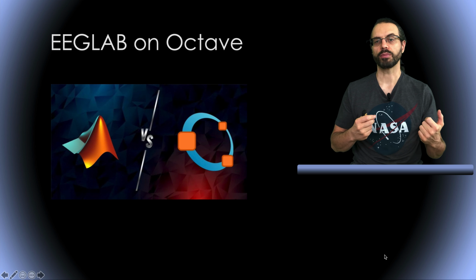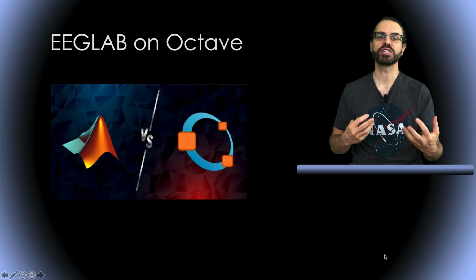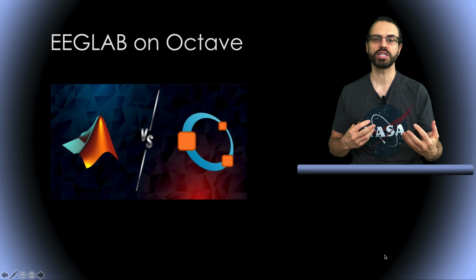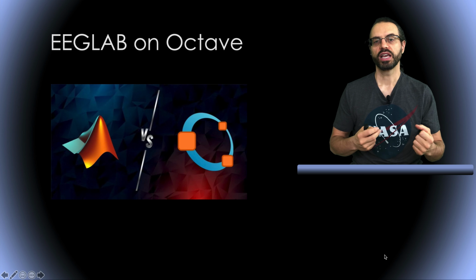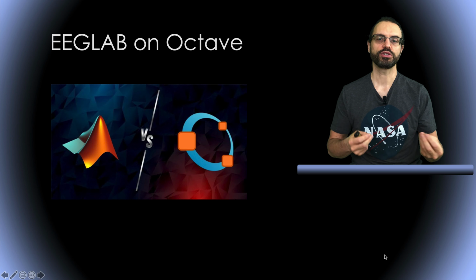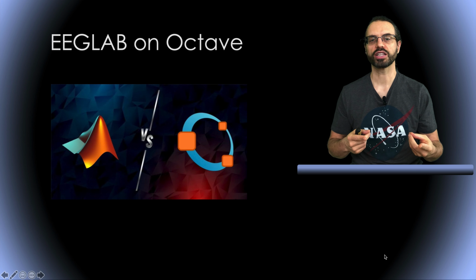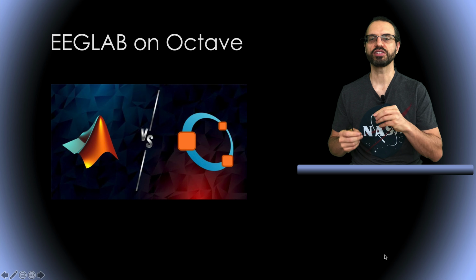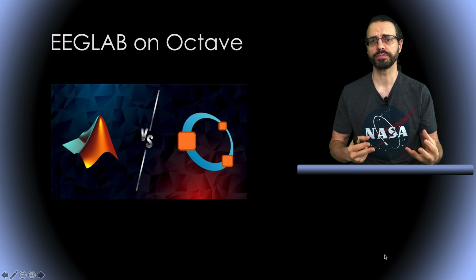Octave has come a long way in the past few years to increase compatibility with Matlab, especially graphical compatibility. Although the core EEGLAB code should be fully compatible with Octave, this might not be the case for EEGLAB plugins. There are minor differences. Most of the time, Matlab executes faster than Octave. Also, you cannot use the EEGLAB plugin manager on Octave. Instead, you have to install plugins by downloading them from the web and placing them in the EEGLAB plugin folder.